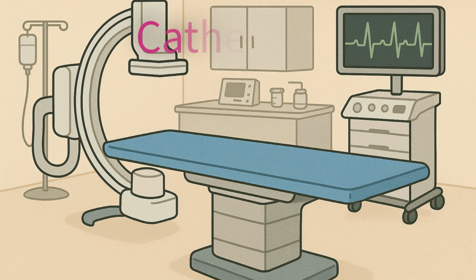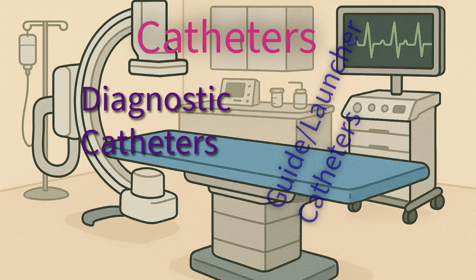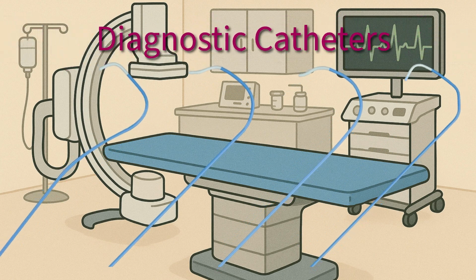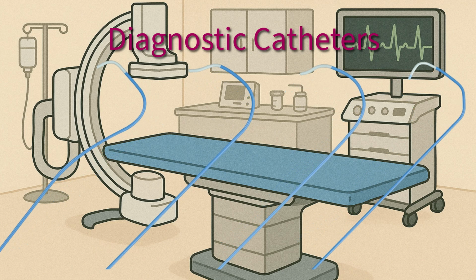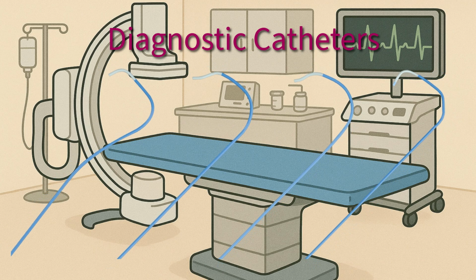Today we're going to talk about catheters. As you may have seen, there are a number of different catheters available in the Cath Lab. You have your diagnostic catheters and your guide catheters. Similar but different. Your diagnostic catheters are what you're going to use for just diagnostic exams. It says it right there in the name.